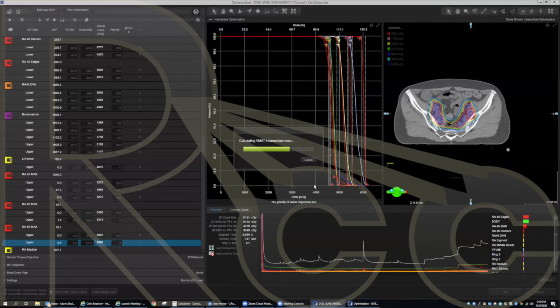So even if I had to do a second iteration, you're probably looking at 15 to 20 minutes to fine tune something that you didn't see the first time. Yeah, because with the extra structures that you can create, you are chasing things, and then you fix one place, but then it goes somewhere else, and then you keep adding and adding.